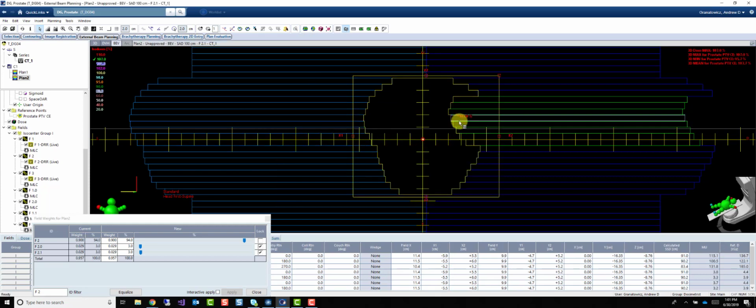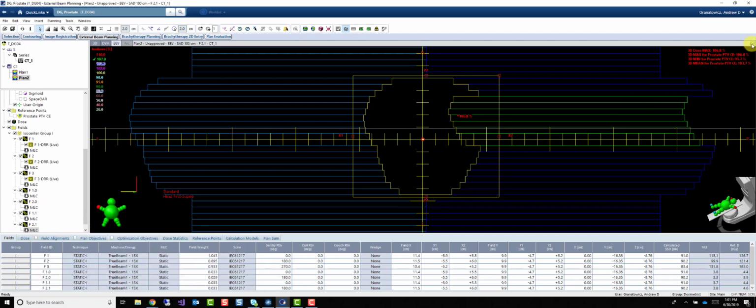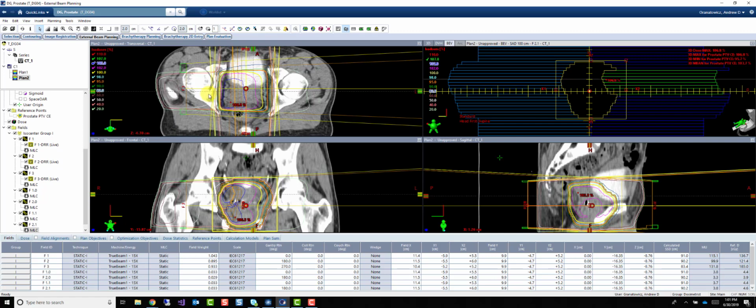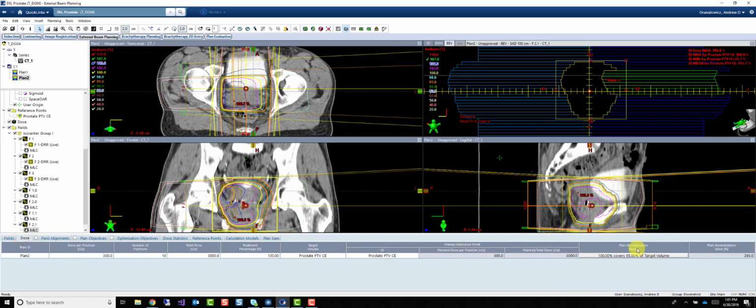Okay, there you go. 107 is gone. It is 107 right there. So if we wanted it to actually be below 107, we can just add a little bit maybe to this last field and field. There we go, 106.8. Our 107 is now all gone. We know we have the right coverage because we're normalizing based on coverage here. So we're now done with this plan.